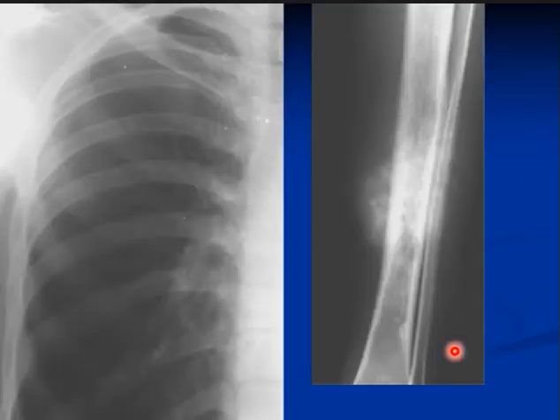What do we have? A front view of the chest, a magnified view of the chest, and a frontal view of the leg. Okay, the leg is also showing. Let's start with the leg.